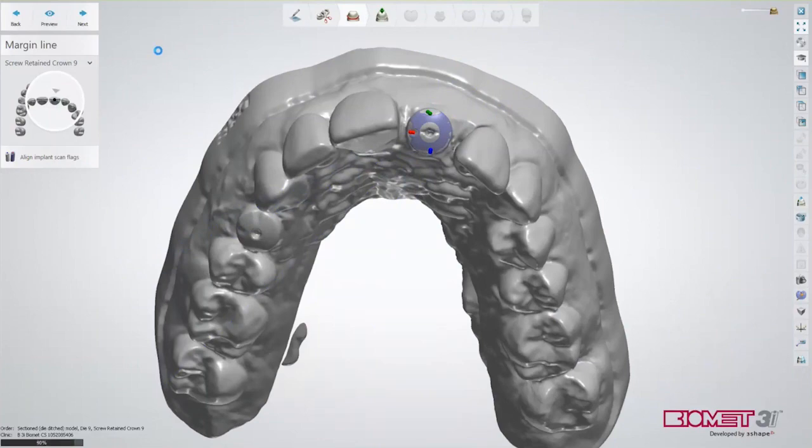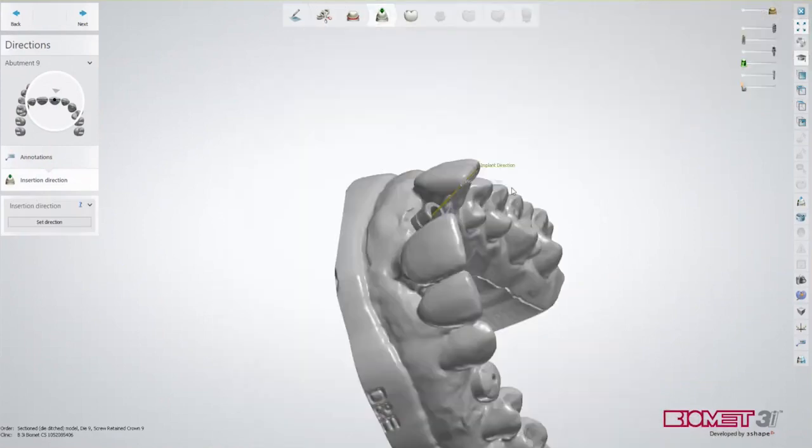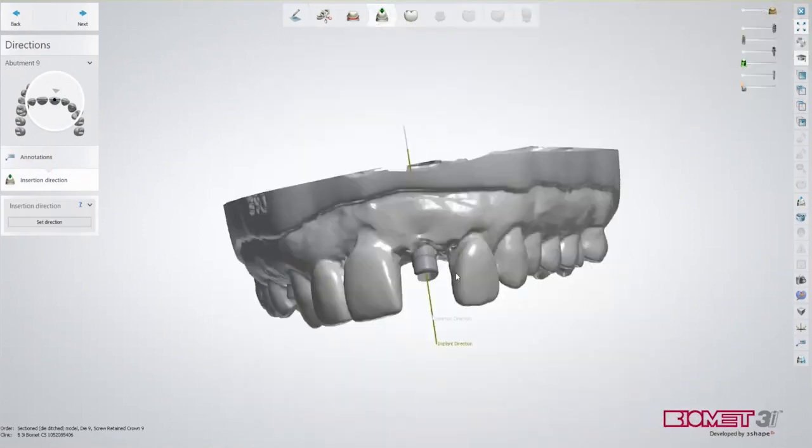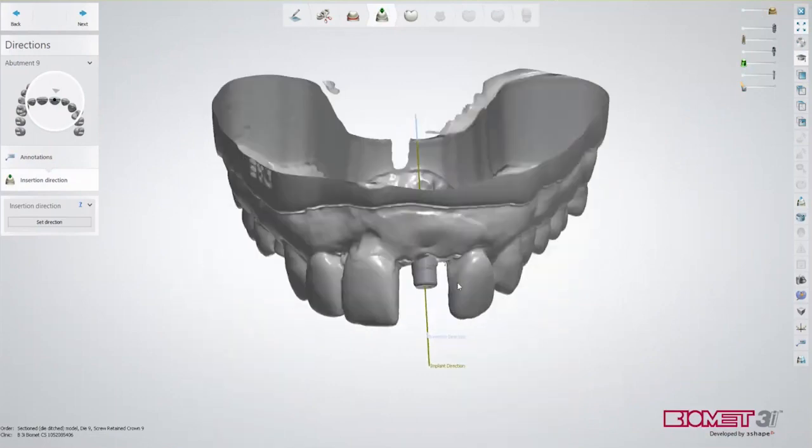Now 3Shape is calculating the alignment in the digital model, and we'll remove our ENCODE healing abutment to allow us to begin our design. This did, and it places the Express Flex TI base that we chose, the 4.75, perfectly aligned in the digital model.